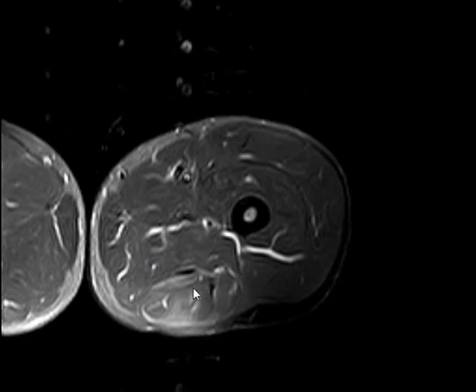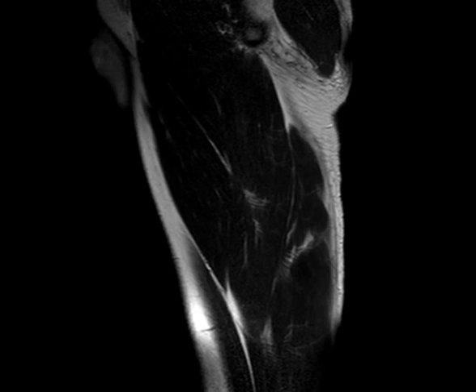So, what's your report? What are you going to write in the report? Do you really need contrast for such a case? Is there a lesion or abscess or collection to give contrast for? Maybe infiltration. First of all, you need to identify what's the pathology. The radiological abnormality is an area of increased T2 signal intensity in one of the muscles of the thigh.